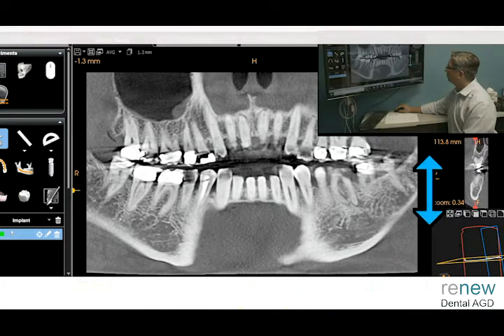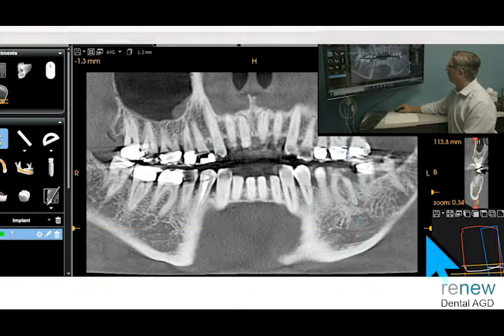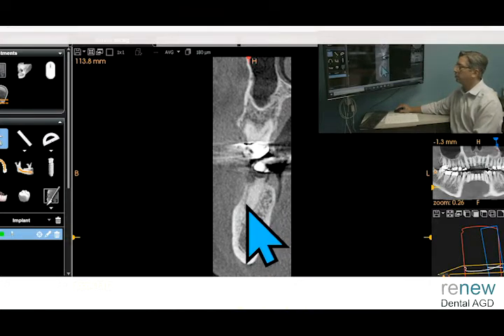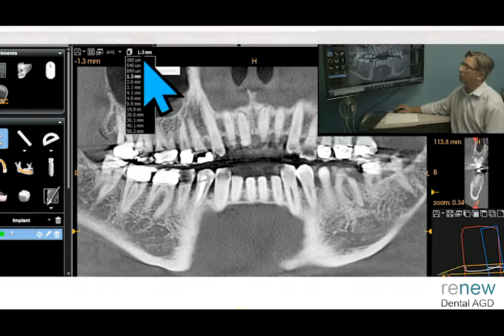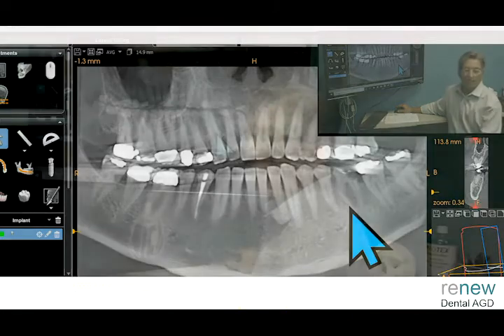And then what I'll do is take this bar and put it way down here. So now I know the nerve on this site is actually way down here, and that's where my nerve is relative to the base of this particular root. So we have a lot of bone here. We have even more bone going down here. So we don't have to worry about where the nerve is. This is a really, really good situation to be a beginning case for someone to follow through and do a single implant tooth replacement.